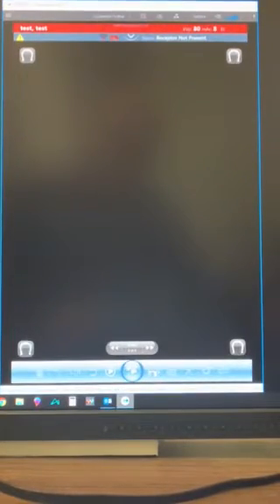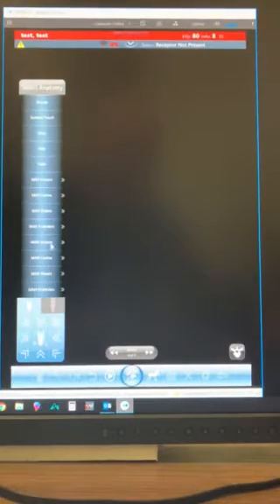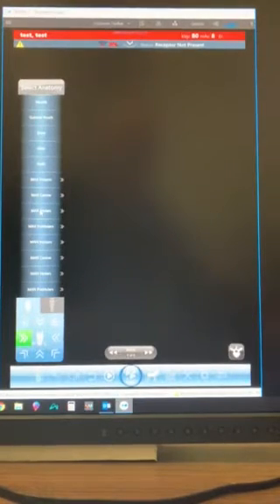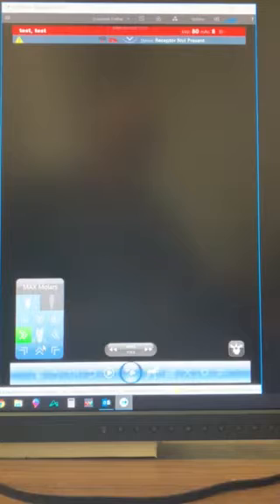If they want to go and take an extraoral headshot, they would select the icon down here to leave the distal extremity pickers, and they will have their head icon and select that. And now they would see all those same structures as before, except this time when they do select the lateral in this view, well, let's pick an anatomy first, and then a lateral. They would actually be activating the flat panel detector to take this exam in this shot.